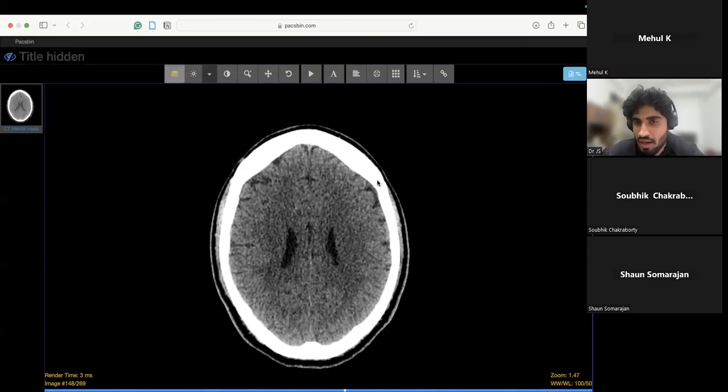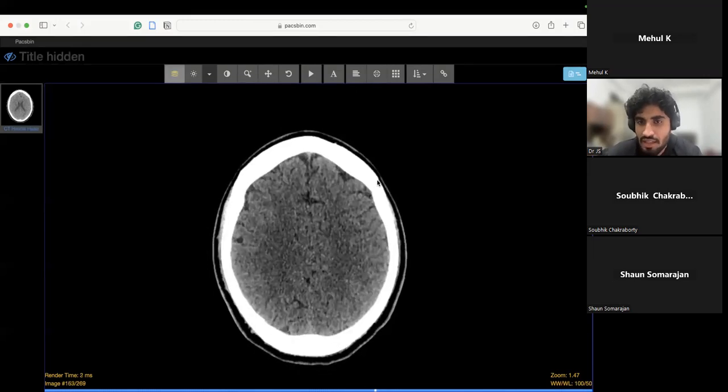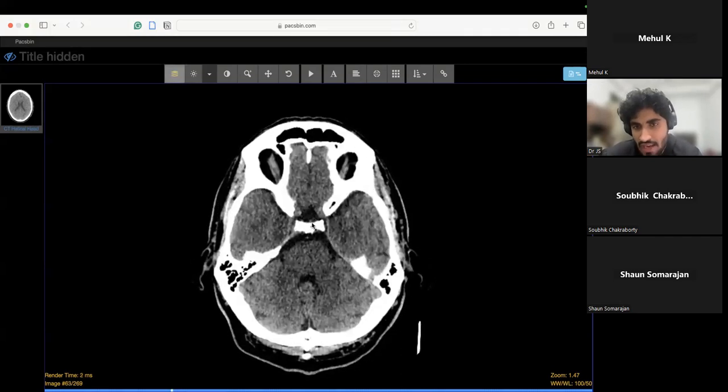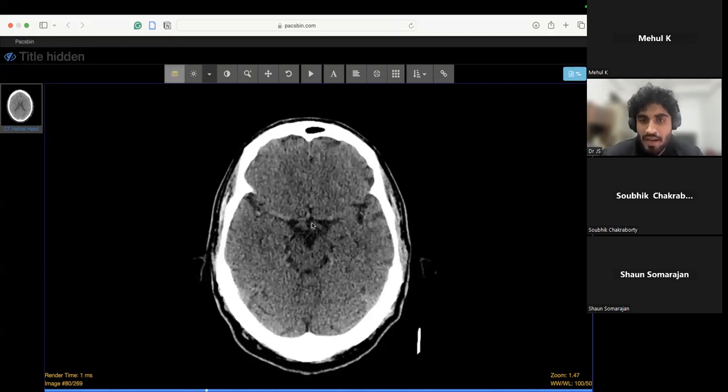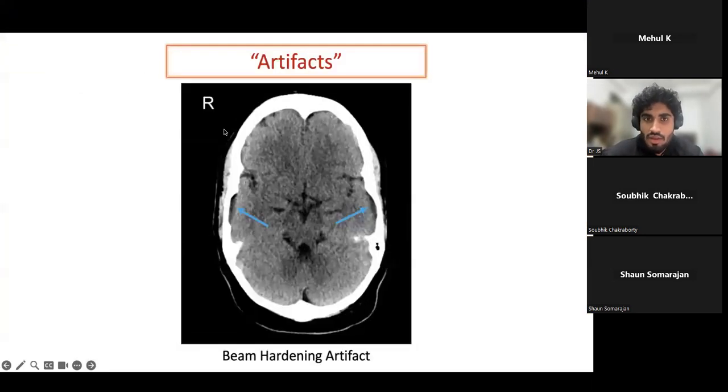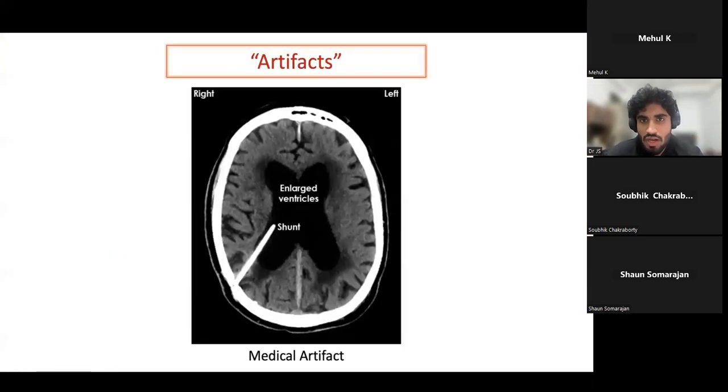When there is a breakage, or a tear of blood vessels, there can be accumulation of blood in the epidural space. That is a potential space. It can expand later on. Similarly, there are some other spaces which you can see here. Some structures are black and white, and some shades of gray are available. I'll discuss that. So what are the usual things which we see? Usually epidural, subdural, and other things, right?